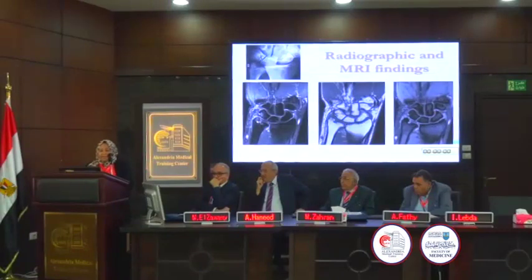Here, the MRI of a different patient, but here we can notice that it's not extremely long, but it's thicker than normal. It's thicker here, the height is not extremely longer than normal, but it's thicker than normal. And we can find the characteristic MRI findings of the ulnar styloid impaction with the chondromalacia with signal alteration of the articular cartilage at the ulnar side of the triquetrum, and ulnar head with subchondral marrow edema on both sides.